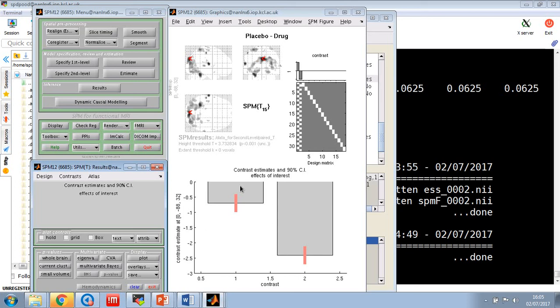A slightly different coordinate as well. This region's basically probably only marginally more activated in control than during motor, but on the drug, there's either a much increased response in this area during the control condition, which is probably what's actually happening, or massively reduced activation of the motor task. It's the cuneus, so probably the drug's enhanced the control-related activation here, which is probably to do with attentional mechanisms. And that's it.